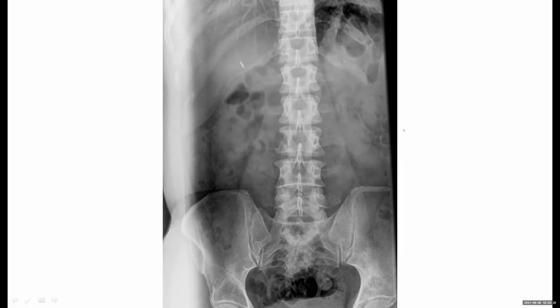So any lesion in the lumbar spine, ma'am? Yes, the vertebral bodies are of normal heights with normal pedicles. However, I cannot appreciate the right pedicle and also the transverse process of the L3 vertebral body. So how would you like to take this further, ma'am? I suggest an MRI to take my case further.